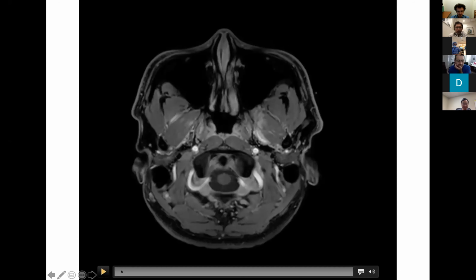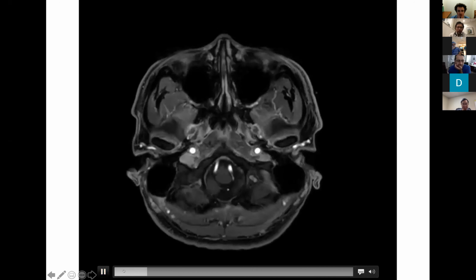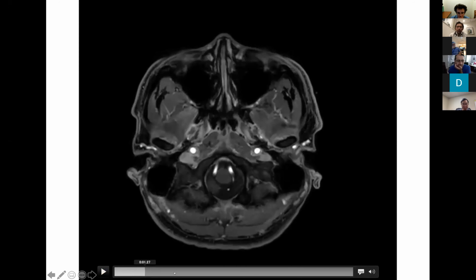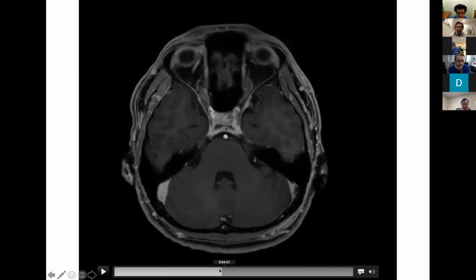And also, not very well known, I've learned recently that we see a lot of these too. This is very difficult to see. The bridging veins to the marginal sinus or the sinuses around this area, like anterior condylar veins. This one, I think, has another one attached to the cavernous sinus also.